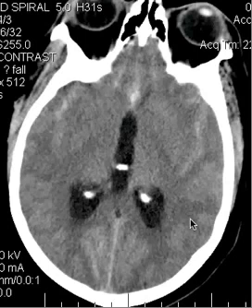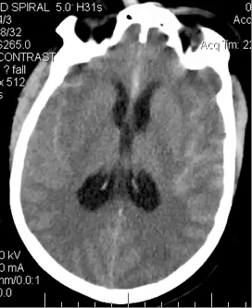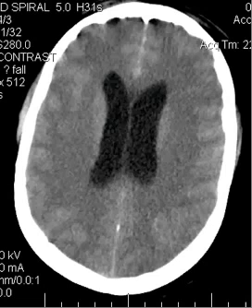And it's important to see the discrepancy between the size of the lateral ventricles and the third ventricle and fourth ventricle, which are moderately large, to that of the cortical sulci, which are basically completely absent. And that indicates that the ventricles are dilating to such an extent that they're increasing the pressure of the hemispheres and squeezing the little bit of CSF out of the sulci that was there prior to the hemorrhage.